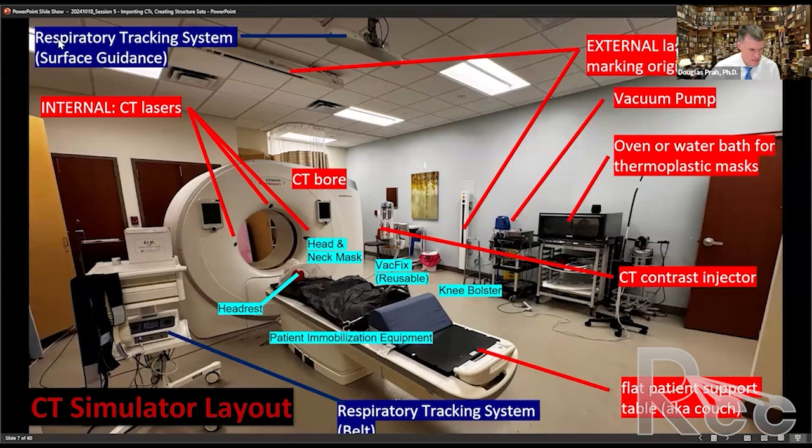I did want to highlight two other systems. I'm going to spend a little time talking about the respiratory tracking system. You can either use a camera-based system that uses visual feedback or a respiratory tracking system. At our site, we predominantly use this respiratory tracking system, which is just a bellows around the patient to do that. But that's only for the cases of thoracic or abdomen that would have larger motion that you might be concerned about.